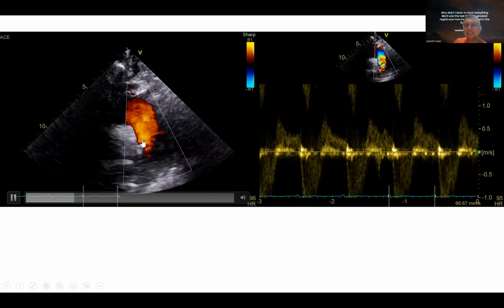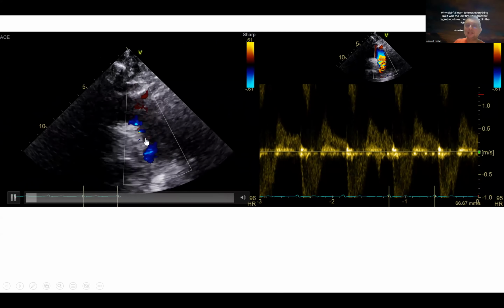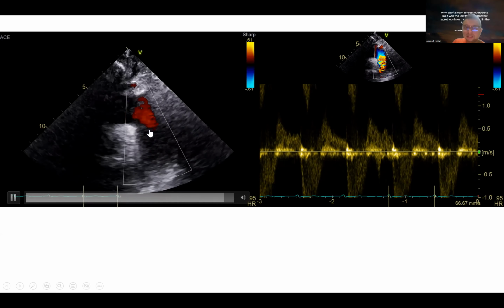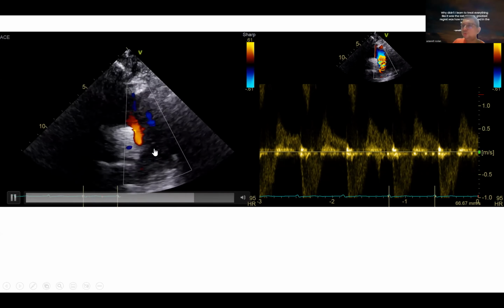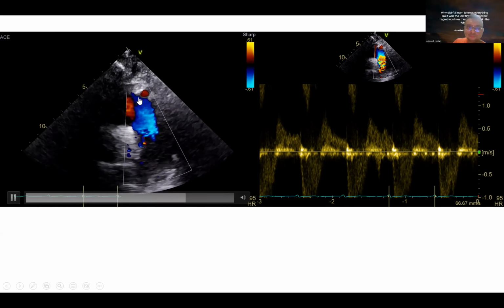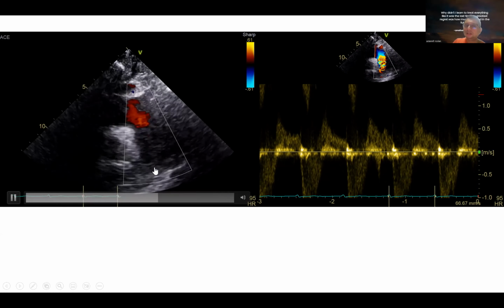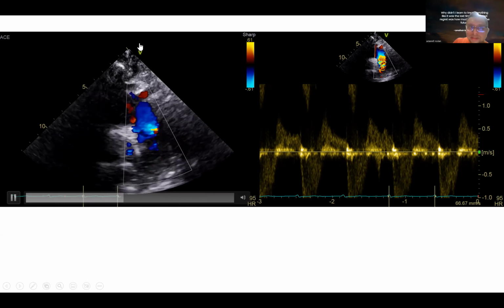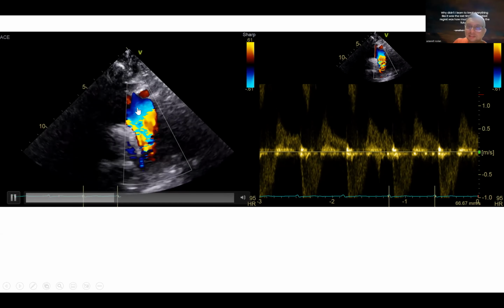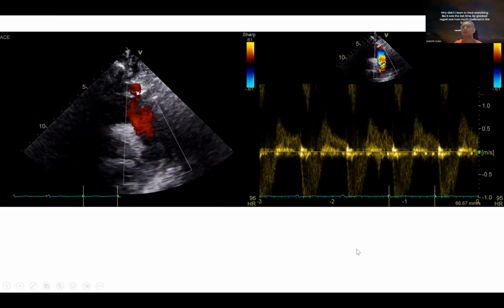But this clinches it for me, this is severe aortic regurgitation. Remember, I showed you in the previous images, in this view, there should always be blue flow only. Blue flow meaning that the flow is going down the descending aorta. Okay, but why do you have red flow towards the probe? So this is reversal, and you can see here there is diastolic reversal in the descending aorta.